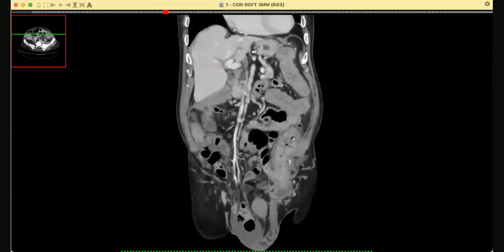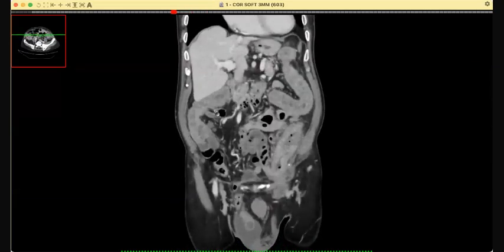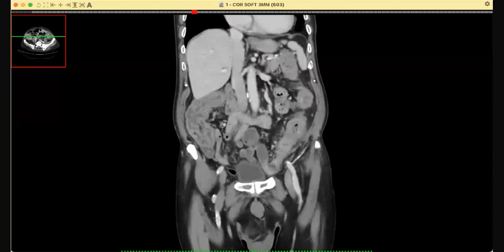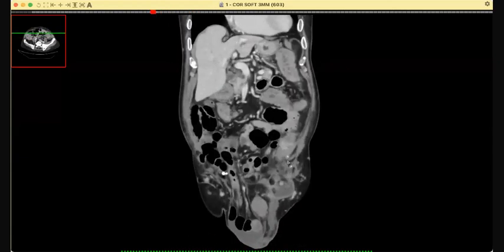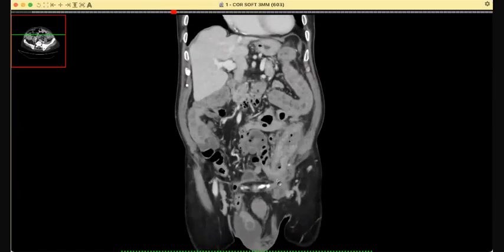so as far as the colon is concerned, we can see a picture of sort of pancolitis, and this is the segment which was visible on the plain film. It is slightly one day delayed film, so it is not the same gas pattern. And then it goes into the hernia. I did not have time to show the hernia in detail to the candidate, so don't worry about it. You did well. But having said that, it was not causing obstruction.